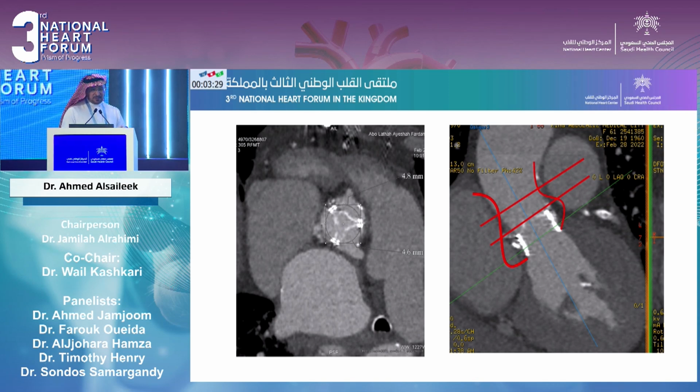If you are dilating the new valve or doing some maneuver to fracture the bioprosthetic valve which is there, this distance has to be even larger. We can also assess this in the long axis. We can see the top leaflet. We can see how narrow the sinuses are, and the distance between the valve and the sinotubular junction is also very small. So there are three distances: the bioprosthetic valve to the sinotubular junction, the valve to the sinuses, and the valve to the coronaries. All of them have to be adequate.